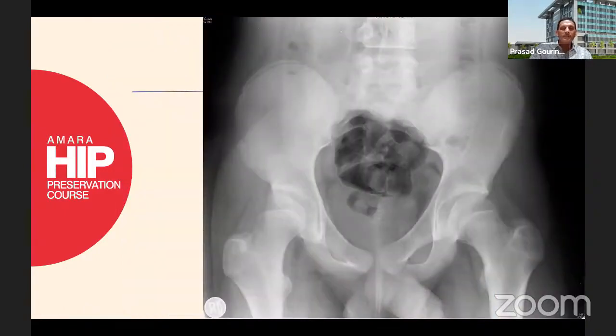Here's a case of dysplasia. Here the head is subluxated, so you can't really quantify the acetabular size because the head is subluxated. You can't look at the coverage. Horizontal line to the medial edge of the sourcil. That's the increased sourcil angle. That's typical of dysplasia. 0 to 10 is normal. This is almost 15, 20 degrees. So more than 13 is clearly dysplastic. That's your LCE. Like I said, the LCE is less, but if the head is reduced back into place, the LCE will be much more. So with acetabular dysplasia, the coverage, LCE, is not as small as it looks here.